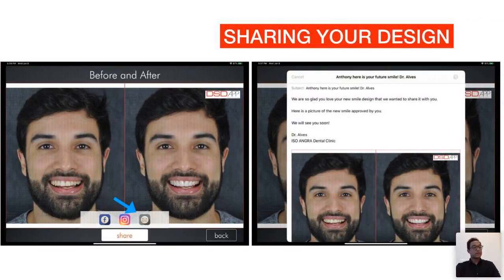All right, so as I said before, you can send that to your patient as a communication tool. It's more than just showing a before and after, it's also a way for you to emotionally connect that patient with the treatment plan in order to get a higher case acceptance rate. And I can guarantee you that your patient will never forget you, because now he knows that you're not just placing some teeth here and there. You're not that doctor that shows the pain, but you're the doctor that shows the solution.